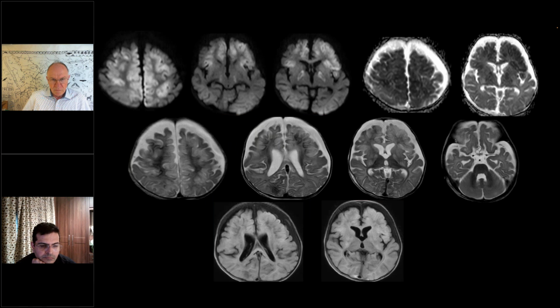Nihaal, why would you think of hemophagocytic lymphohistiocytosis? There are definite border zone infarcts with globus pallidus hyperintensity and DW restriction. No, I thought the time frame was 6 months. Genetic perforin induced, where you have globus pallidus and maybe sometimes cerebellar involvement without diffusion restriction, because that's an inflammatory disorder. I thought the post cardiac arrest was at 5 months and the scan was done at 11 months. No, this was 15 days after the surgery. Sorry, okay.